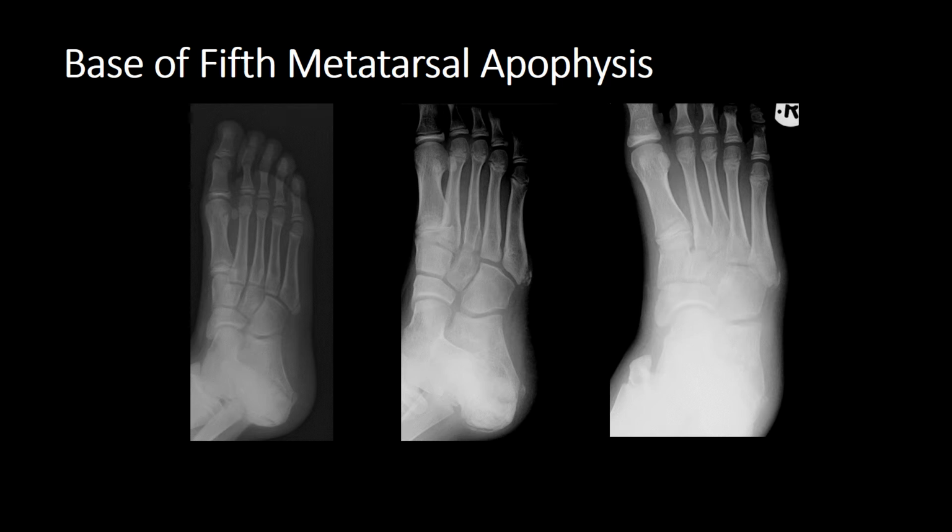In addition, when the patient is put into a DP oblique position, the diverging ray can create the appearance of the apophysis being much further away from the adjacent host bone than it actually is. This again is a normal appearance.